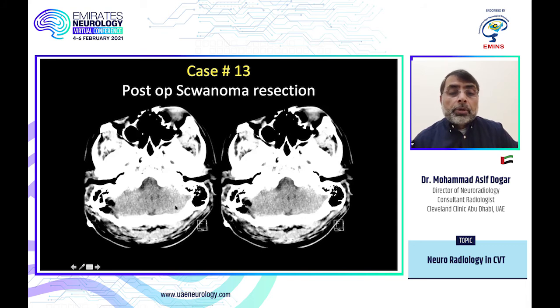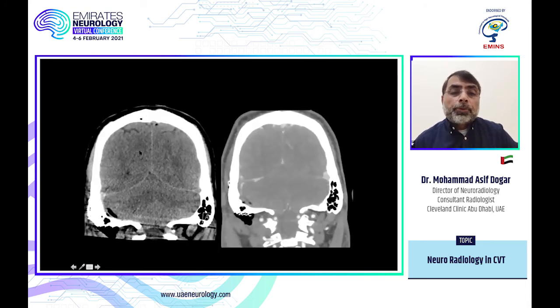I cannot see anything here. This is our friendly coronal image. So compare the sinuses. If this one is dense, and then on the CTV there's a filling defect. So again, I use internal reference, normal density, and this is hyperdense. Although normally we can see hyperdensity like this in a sinus, the point is this differential density. So whenever posterior fossa surgery, look for the patency of the transverse sinus or sigmoid sinus.